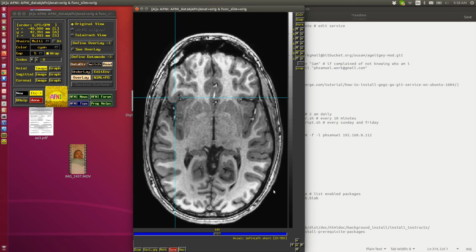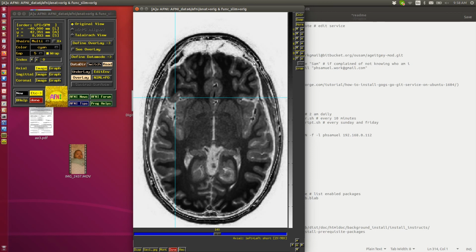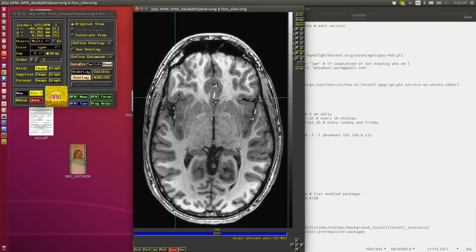If you click this button at the top, it says swap. That just turns the intensity bar upside down, and now 0.56 maps to white. Is this swap useful? Not very often, but it was there because this original viewer in AFNI is derived from an earlier program I wrote called FD2, which only did slices, which was itself adapted from another program called FD, and it had this swap button, which some people liked at the time.